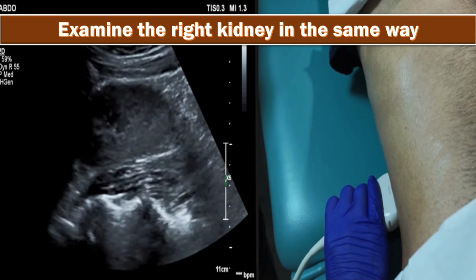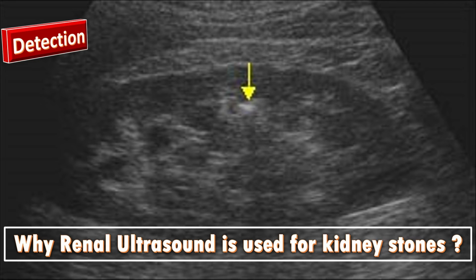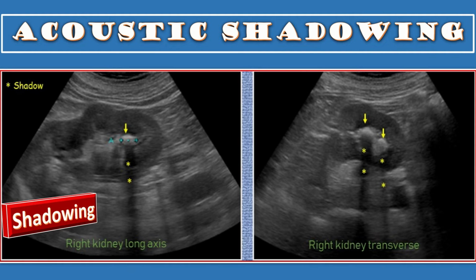Now, why is renal ultrasound used for kidney stone detection? In fact, renal ultrasound can effectively detect kidney stones, which appear as bright echogenic foci or white spots on the images. Stones often create a shadow behind them called acoustic shadowing, further aiding in their identification.